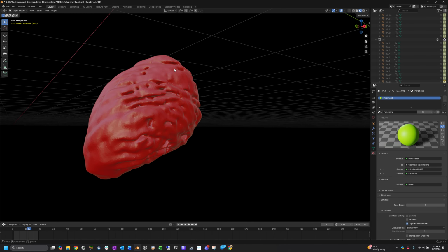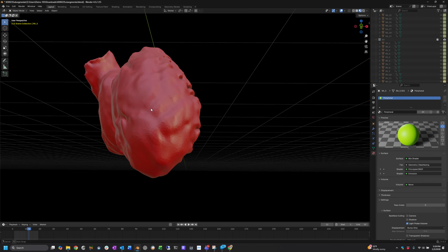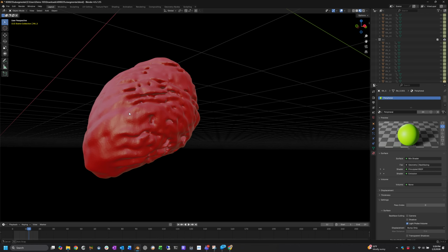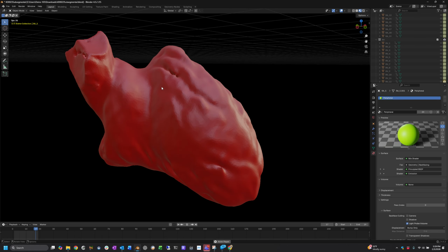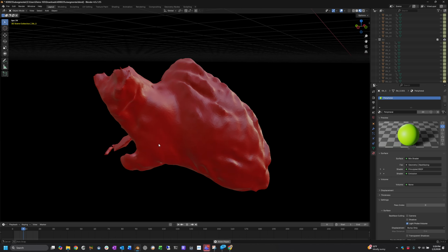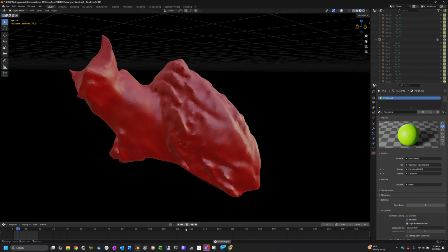And really this is about as good as we're going to get, this is pretty good. We need to make sure that our solution covers that. Now this is a much simpler result, but I want to see how it performs. And again, my hope is that this could do fairly well with that. So now let's talk about, do we need to do anything with the LVOT here?